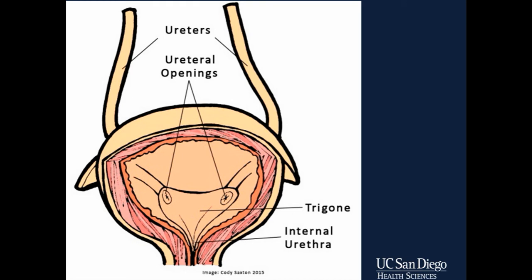Limitations to consider are extensive pelvic scarring or overlying bowel gas that may make scanning the bladder difficult. Also, if the bladder is not sufficiently distended, pathology may be hidden by the folds.